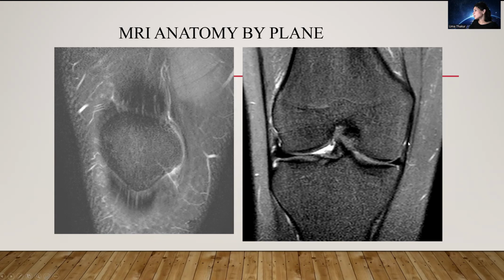Then we go more posteriorly, and you're seeing the MCL, which is nice, black, contiguous, the iliotibial band, the medial and lateral compartmental cartilage, the distal attachment site of the ACL and the proximal attachment site of the PCL, and the menisci, both the medial and lateral, which are homogeneously black with sharp inner margins, as they should be. Because you're assessing all these critical structures on this plane, David Stoller, a radiologist who's considered the father of sports imaging, once called this the money plane.